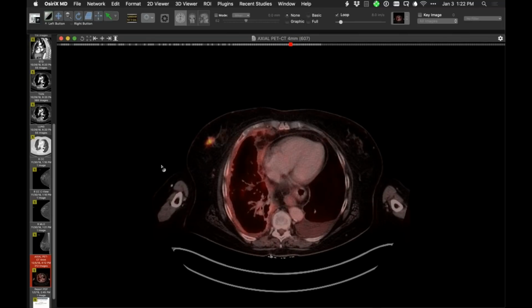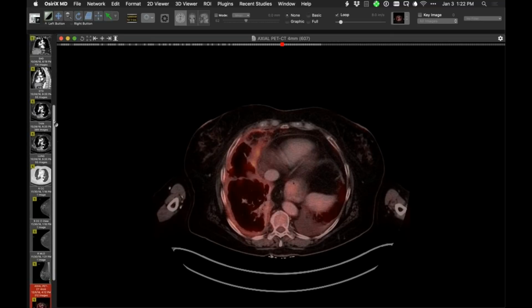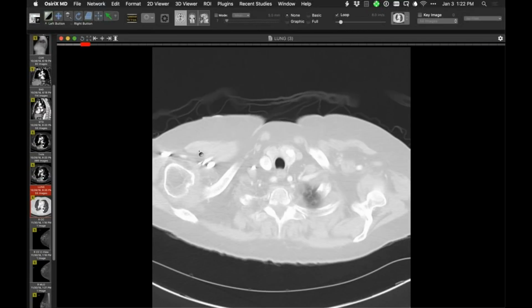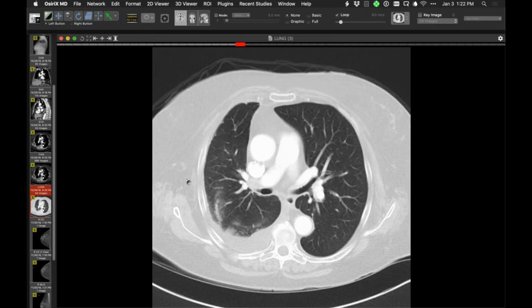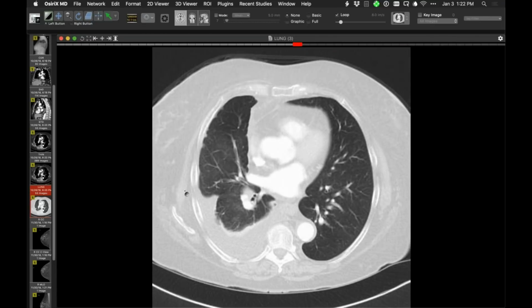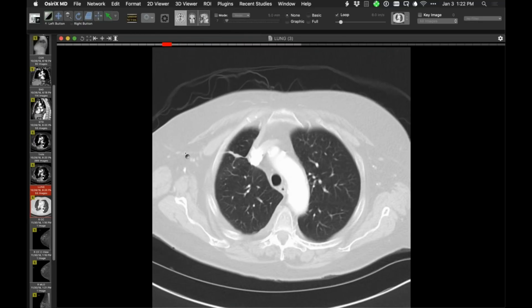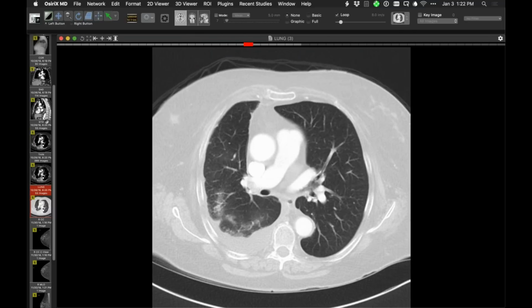So Howard, another thing that's really helpful in this with a mysterious pleural effusion and no visible pleural masses is to look at a lung window and skim through the minor fissure and major fissures, because often you'll see tiny little nodularity along fissures. Yeah. Sometimes you catch it in tangent. This one is not cooperating, but I've seen tiny little pleural nodules on this, on the lung window that really are a clue, again, that it's malignant.